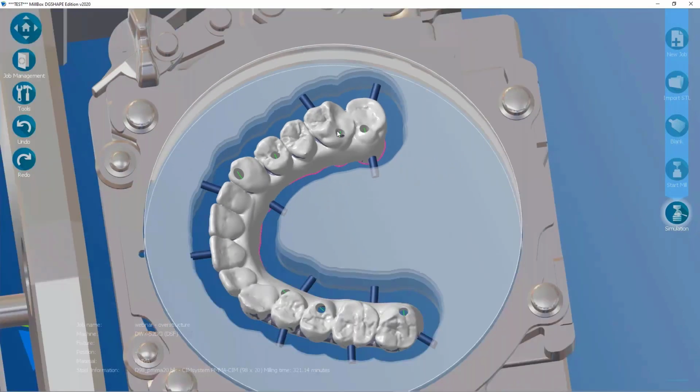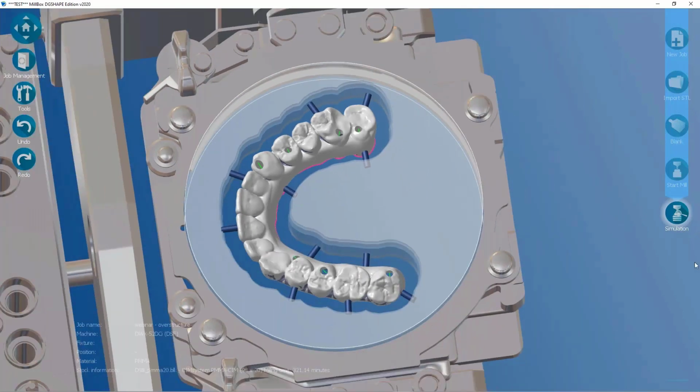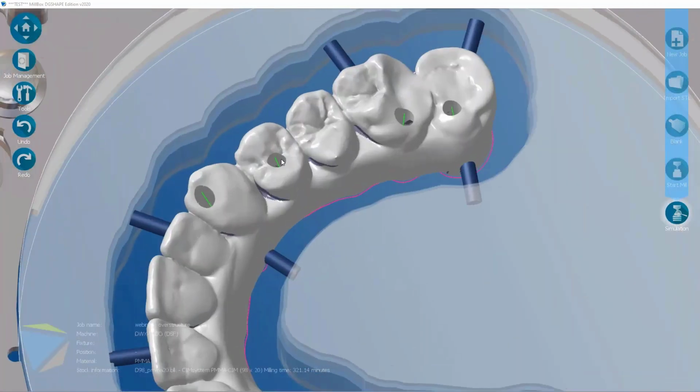How many arguments haven't you done, Gianmarco? About 20, almost 20, less than 20, but 20. How many are missing? One, just one. Okay, you were on time. You can also show only, just click on the one hole and change the size of the hole, just to show the new interface. You will still have 1 minute to show.